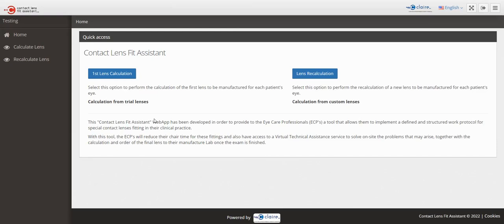Hi everyone, and welcome to this video where you'll see a walkthrough of the ICD scleral lens fitting tool. This tool was developed as Claire's MVP, so it was developed before the clairetool.com official platform, and that's why some steps and its look and feel are a bit different. This tool will be integrated as another premium web app in the clairetool.com main platform.